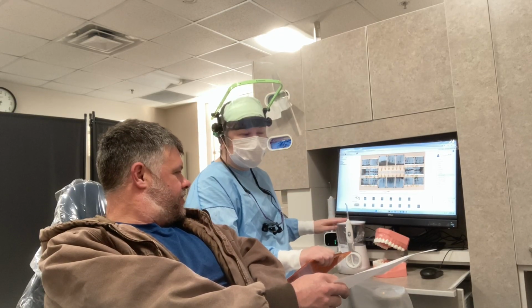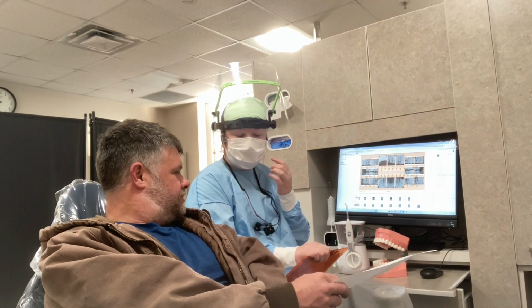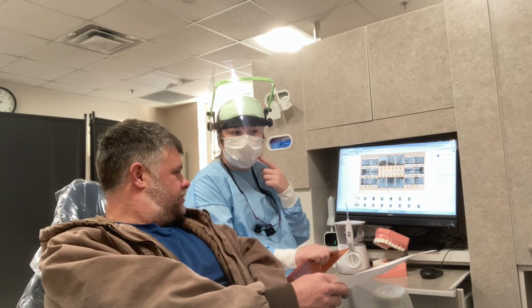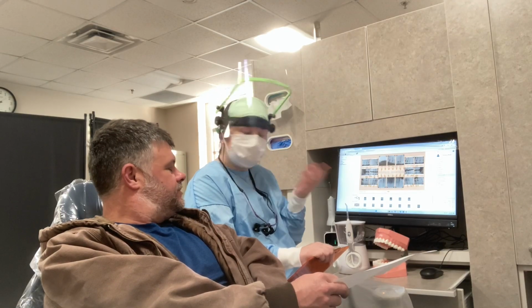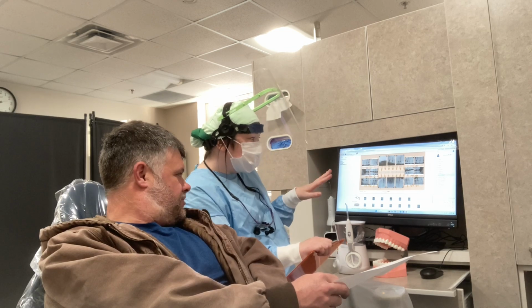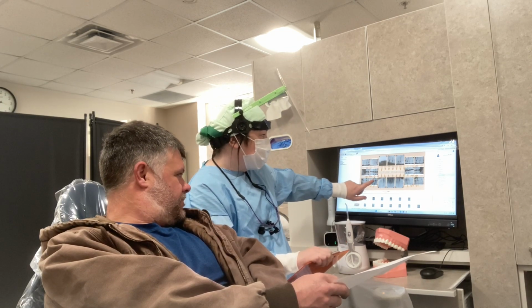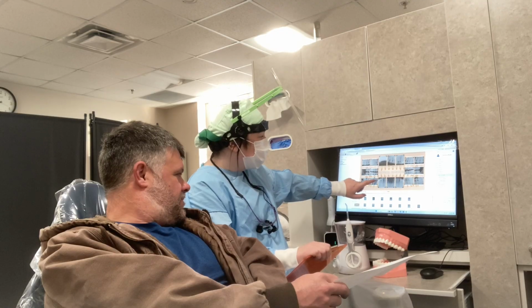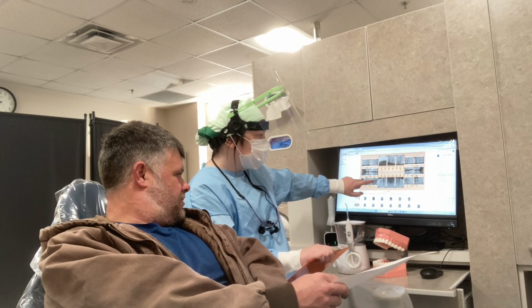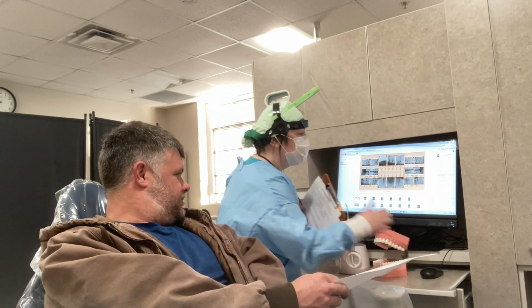Based on what we talked about and also what I've seen, you have them on the cheek surface too. You have one on the biting surface, or the occlusal surface, and then you have another one on the buccal surface, or the cheek surface. So that was kind of interesting to see. You also have something that's really difficult to see in this because it's not as radiopaque, and that's going to be a composite filling. That's on this little tooth right here, this premolar tooth. You can tell because it looks a little bit different than your typical enamel. So the typical enamel, let me zoom in on this.